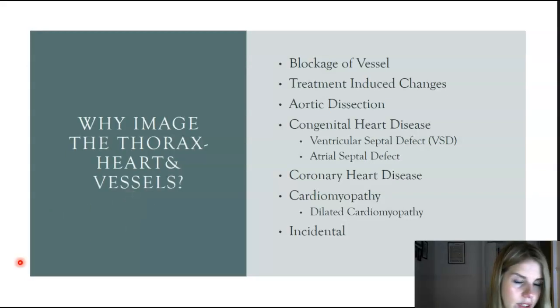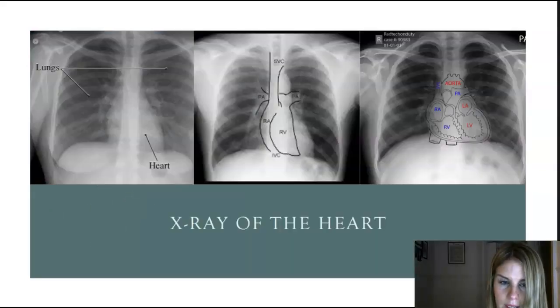So moving on to the next slide. The first thing we're going to look at is just the basic x-ray. So it's not the most exciting thing to look at when you're looking at the heart, but it does give us some information to go on, which is why we do assess the heart when we're looking at a chest x-ray.